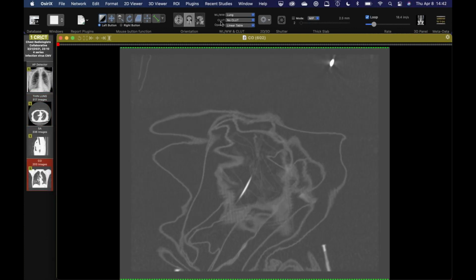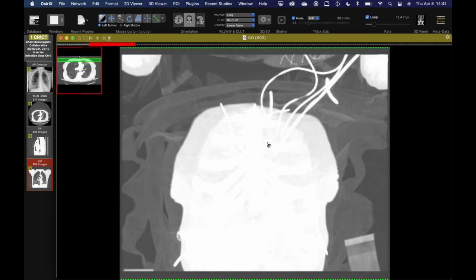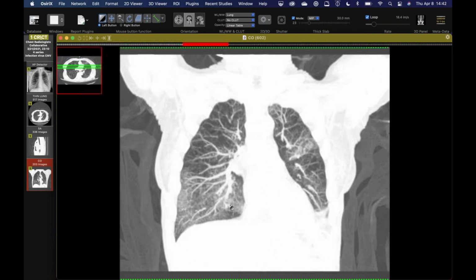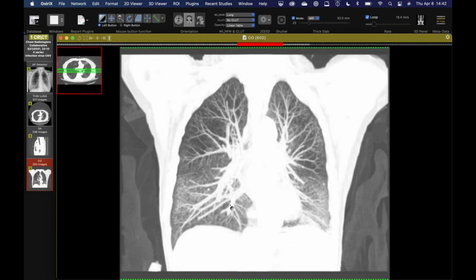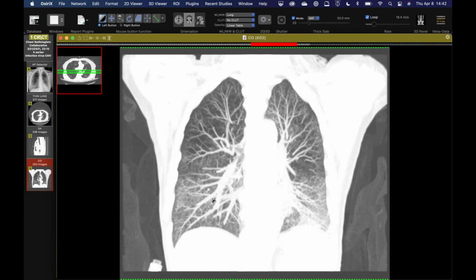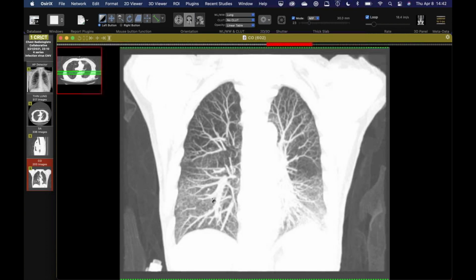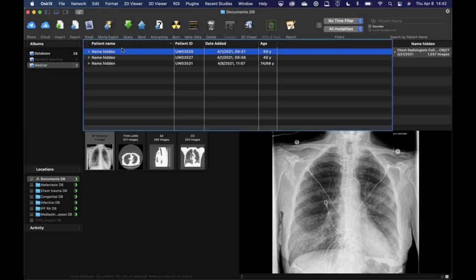I'll put the coronals up and make them MIP real quickly just to bring them out a little bit. But you can see all those tiny little nodules there. So that's been my experience with CMV. We often don't pin it down, and it's often sort of a presumptive diagnosis. But given I had a hard time making this all aspergillus, especially since I don't think he was that sick from it. So I don't know, David's probably seen a lot more CMV in the past. I have seen miliary disease from CMV. Okay. So this, yeah, I think it fits. So the patient's being treated appropriately for that.